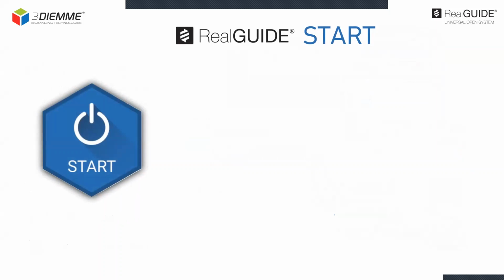Well, RealGUIDE is made up of several licenses with different features. Let's quickly see the possible solutions for each single module.